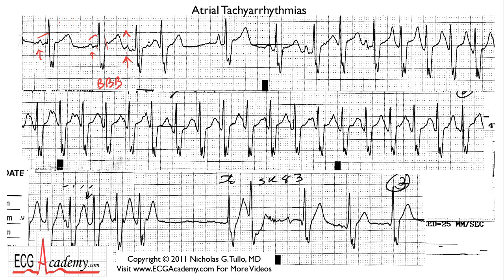And then you have to start to wonder whether this is another P wave because it's a sharp bump that occurs on top of the T. This has to be the T here because it looks the same as this T wave. And so that's another P there that gave rise to this QRS. Then you have a little bit of a pause here, a compensatory pause. So basically what you had here was an atrial couplet. You had 1 and then 2 premature beats in a row that gave rise to this atrial couplet. Now you have a little compensatory pause.